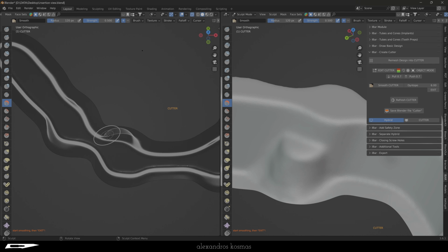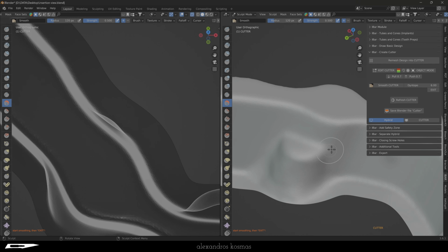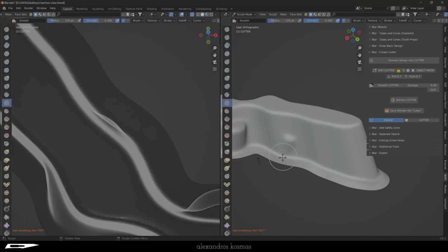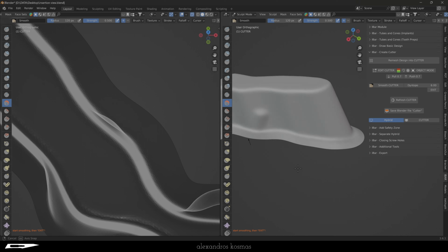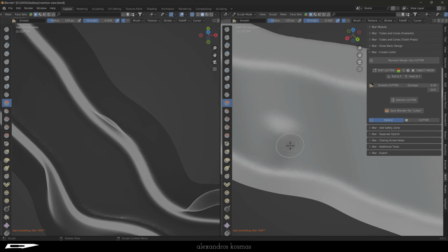I can see easily now that I have undercuts in other areas, like here, and judging by the topology of the extrusion, I believe that I have to add material diagonally from the overhang area down and distal up to the shoulder of the cutter. So let me do that, while I'm checking on the left side of the screen if I eliminate the undercut.